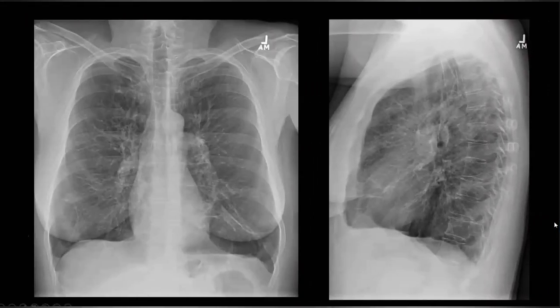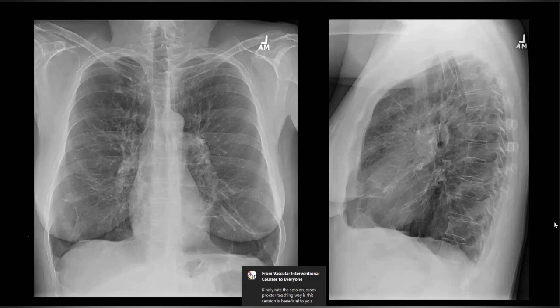I'm provided with this chest X-ray, frontal and lateral projections, showing haze in bilateral lung fields, giving a ground glass pattern. There are increased lung volumes on both sides. So lung volumes are definitely increased. What do you think about these lines? So there's a pattern of interstitial edema.